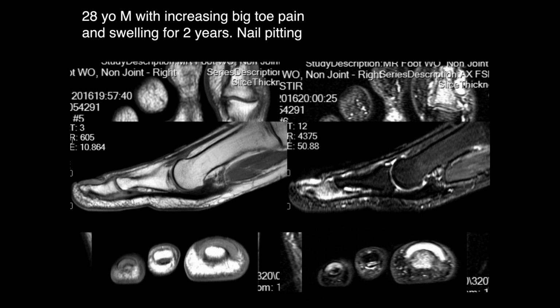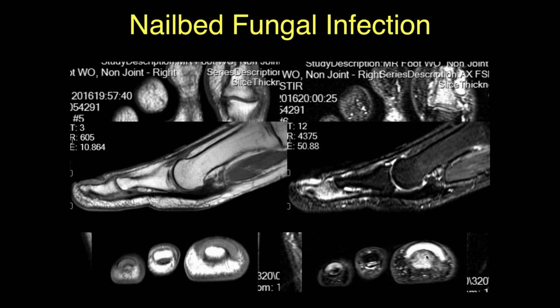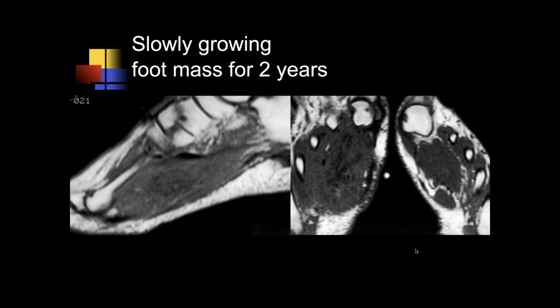And there's a big joint effusion, or there seems to be a lot of, is that at the nail bed? Yeah, it's subungual right here. Yeah, subungual abscess. And this is all a fungal infection of the nail bed. Something that's not too uncommon, especially in the deep South of the U.S., where it stays humid a lot. And these can be very difficult to treat. Jungle. Yeah, jungle.